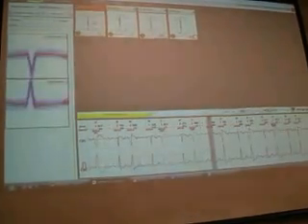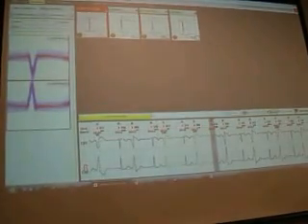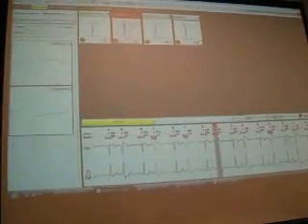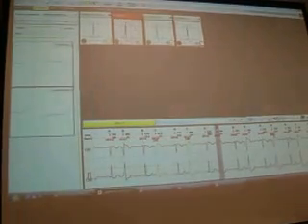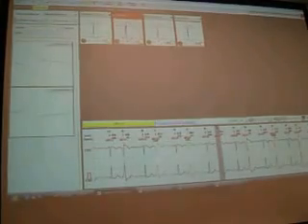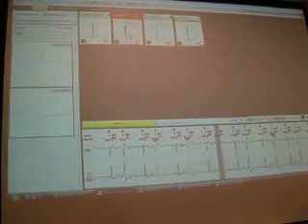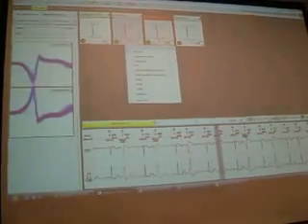On the first cluster, we can see that the type is normal, I accept it. On the next, the type is set normal, but checking the QRS, I suppose that this is rather ventricular, so I rename it ventricular.